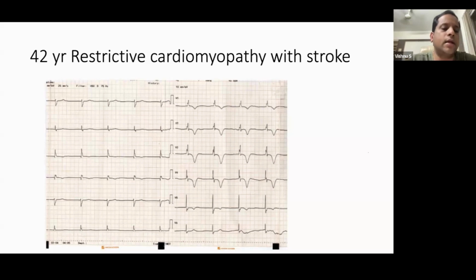This is atrial standstill. It means the atria are inexcitable. The sinus node may be firing, but the atria are not capturing, not exciting. So this is a high risk for stroke. This is atrial standstill.